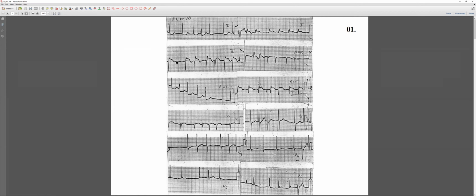If you have rhythmicity without P wave, that can be junctional rhythm if the QRS is narrow or showing right or left bundle branch block picture. Okay, so that is an atrial fibrillation. Go on.